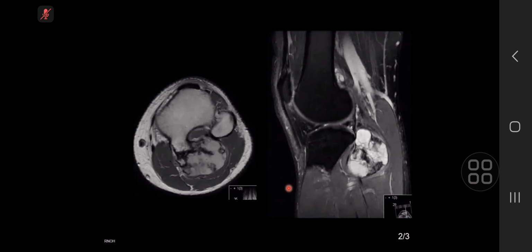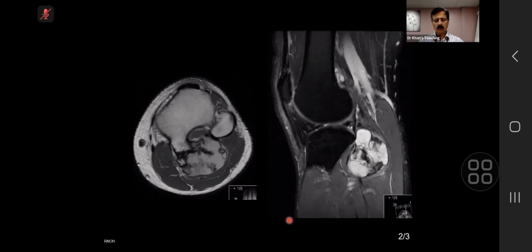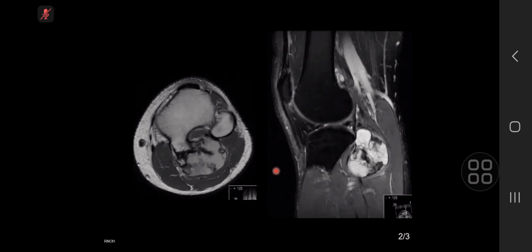The lesion appears to be high signal on STIR and intermediate signal on T1. The cartilage cap appears to be thickened in this case. Excellent. And your conclusion? So I'll be concerned about malignant transformation to a chondrosarcoma. Excellent. And what were you going to do? Send the patient to? I'll send it to a local sarcoma center.